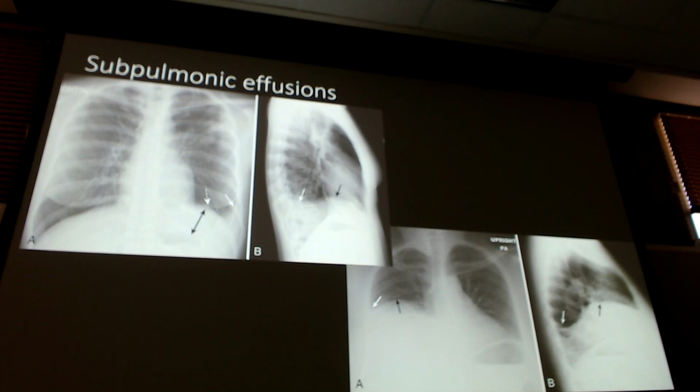See the nice sharp point I have down here? The A's in the way, but a nice sharp point. I don't have that here. Down here, right? See that nice little area there? Don't have that there. Kind of pushing up there a little bit. A little bit of meniscus sign there, but what do I have right down here? What's this? What do we call this area? Spine sign. It's just a generalized term, spine sign.